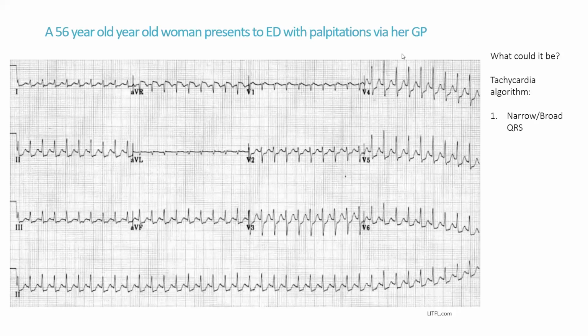Yep, good. I can see I've got my little chart here. Brilliant. Okay, I think somebody's put a thing in, but fair enough. We'll say it's narrow. Moving on. Next thing in our little algorithm here, is it regular or is it irregular? So we just want to write in the chat. Yep, it's regular. Brilliant.